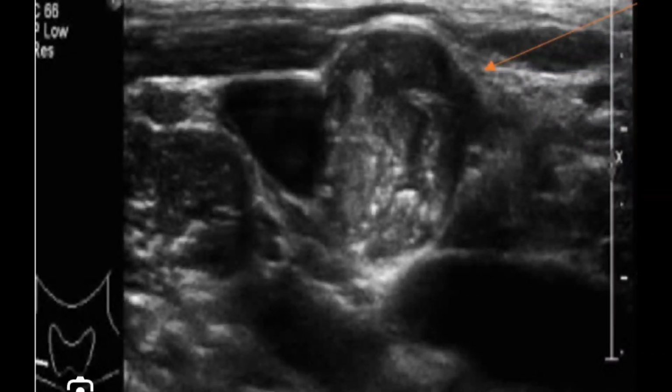Another slide to explain lymphadenopathy associated with a U5 malignant thyroid nodule. Here on this image you can appreciate a nodule within the thyroid gland, and multiple surrounding enlarged cervical lymph nodes can also be seen. This is a very important area, especially when you are talking about associated lymphadenopathy. You must mention whether the anterior triangular lymph nodes or the posterior triangular lymph nodes are enlarged. Or to be more specific, it would be pertinent to mention whether the level 1, 2, 3, 4 or 5 lymph nodes are enlarged.